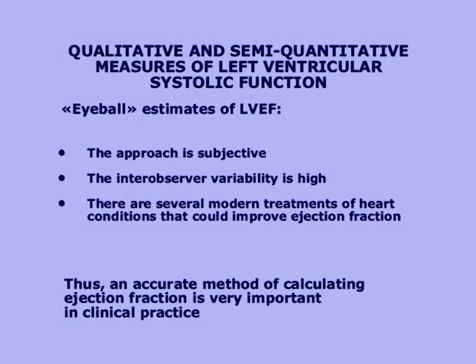Qualitative and semi-quantitative measures of left ventricular systolic function. Eyeball estimates of left ventricular ejection fraction are routinely used in clinical practice, but inter-observer variability is high. Modern treatments of some heart conditions can improve ejection fraction, but this improvement could be no more than a few percentage points. Therefore, an accurate method of calculating ejection fraction is very important in clinical practice.